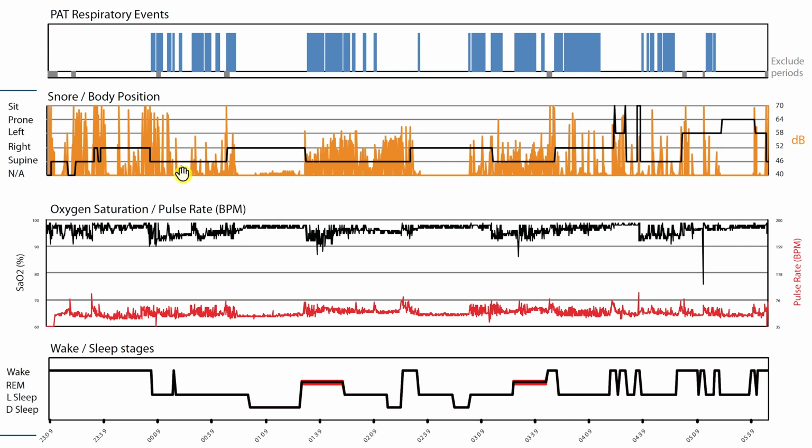This snoring is far less than this snoring, both in volume and in frequency, because you can see there's a lot more snoring here, right? Back to back to back, bars back to back. And here it's kind of, there's a bar here, a little bit higher bar, tiny bar, no bars, smaller bar. Over here, there's no snoring. Snoring sets on.